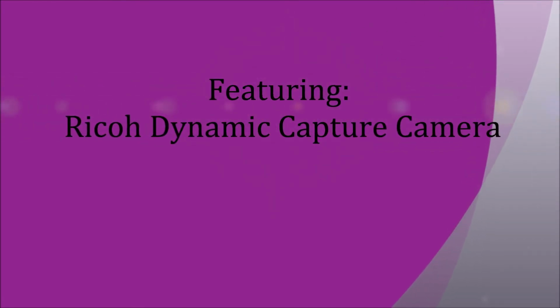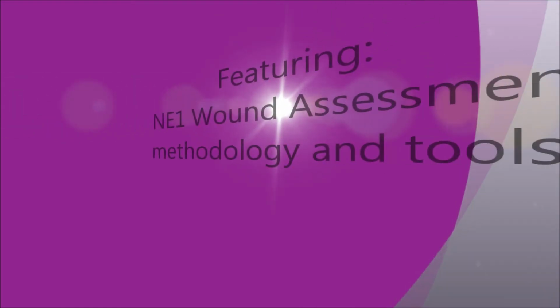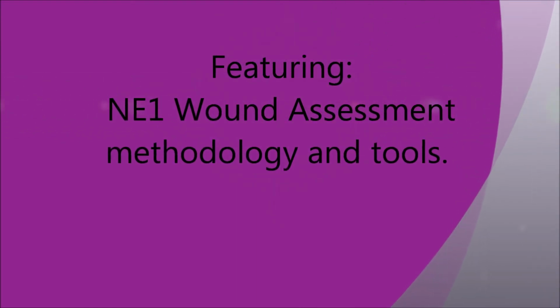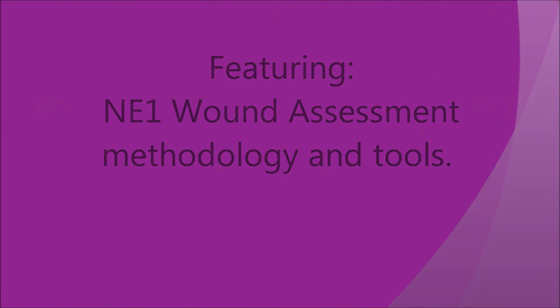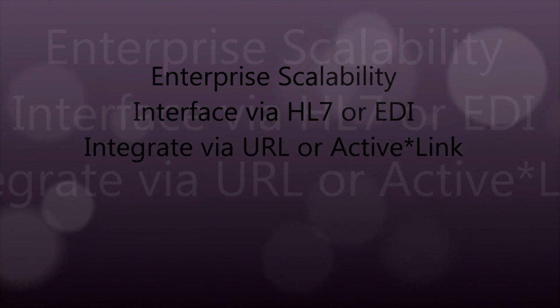HealthE Pix is a workflow-based application that allows you to import, classify, annotate, measure, and archive image data from practically any source. With HealthE Pix, you can deploy an enterprise-scalable picture processing solution that interfaces and integrates with most hospital and practice EMR or other enterprise clinical and communication systems.